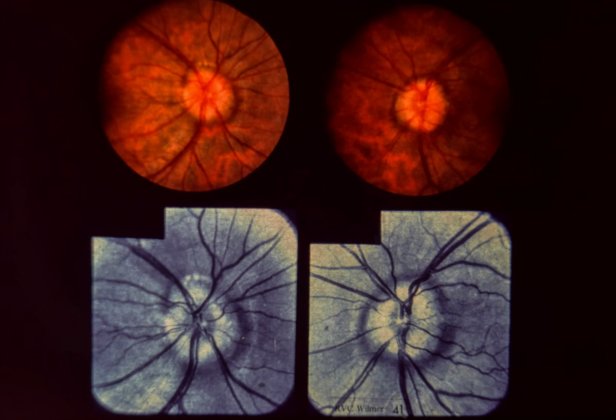Slide 41. Optic disc drusen mistaken for papilledema. On routine eye examination, this 26-year-old male was found to have 20/15 visual acuity and slightly enlarged blind spots in both eyes. Upper left and upper right. Both discs are elevated. However, the retinal vessels are clearly seen as they cross the optic disc surface. This patient's ophthalmologist thought he had papilledema and referred him for neurological evaluation.